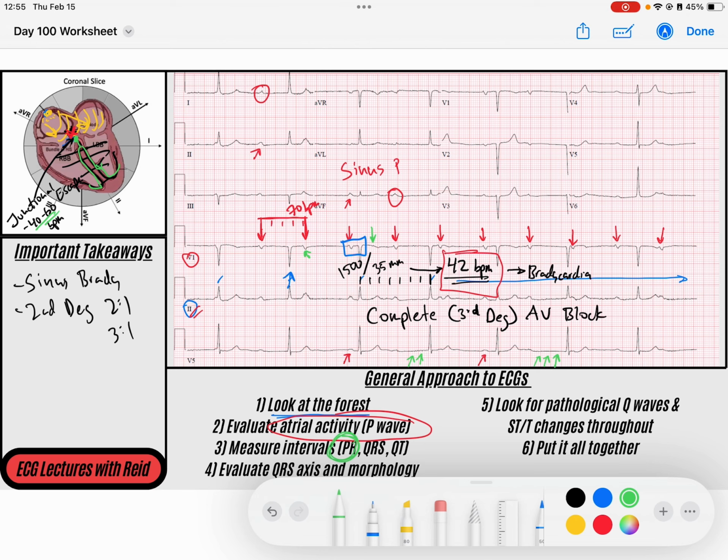And so now that we've established that, let's continue to evaluate our QRS complex. Our QRS is upright in lead 1, and it's narrow, and it's upright in AVF right here. So that tells me that my QRS axis is normal. It's down and to the left. That's good. And my R wave progression, you can see, I don't have much of an R wave here in kind of that septal region, but I do develop an R wave that appears to become dominant here a little bit late in V5, V6.